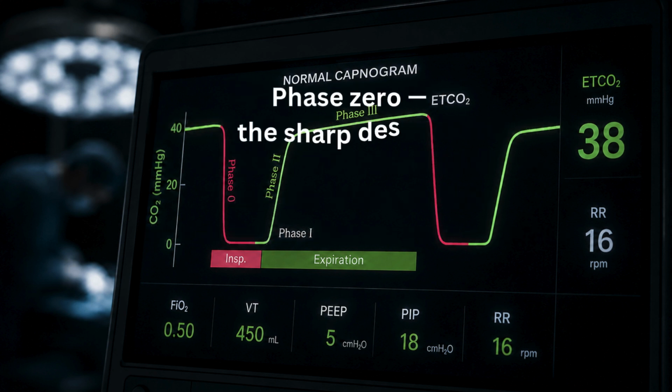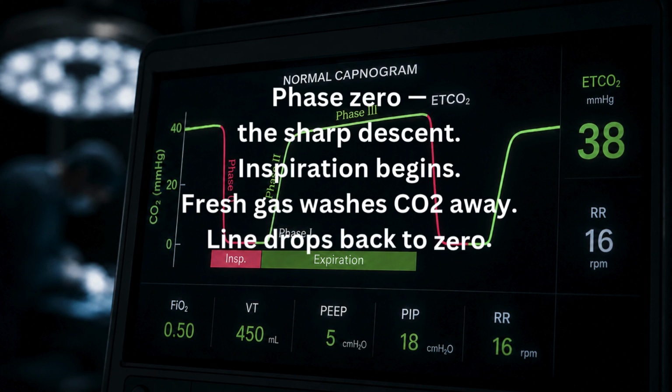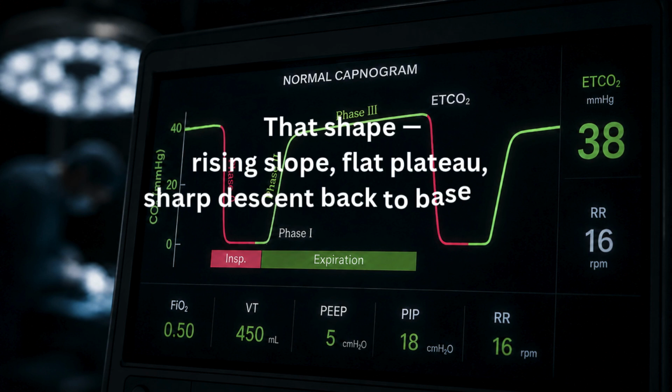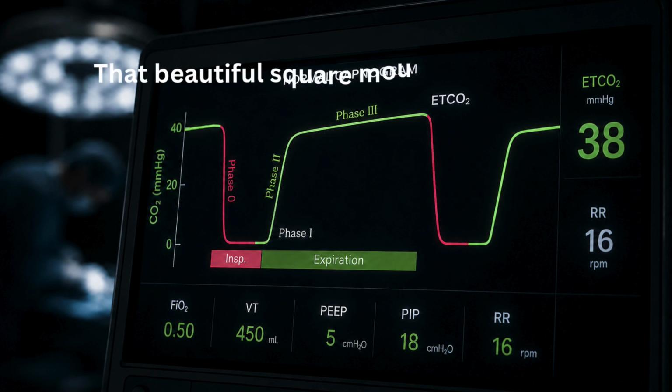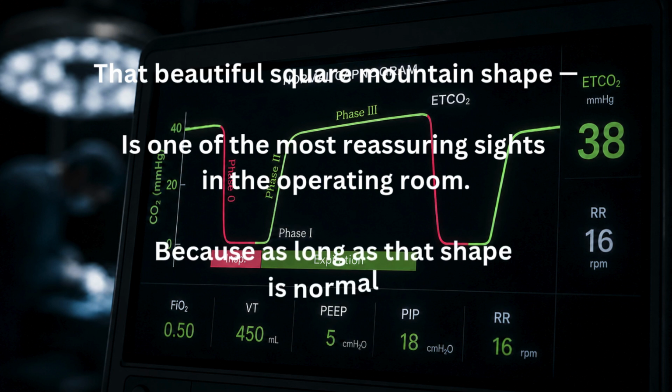Phase 0, the sharp descent. Inspiration begins. Fresh gas washes CO2 away. Line drops back to 0. That shape, rising slope, flat plateau, sharp descent back to baseline. That beautiful square mountain shape is one of the most reassuring sights in the operating room.